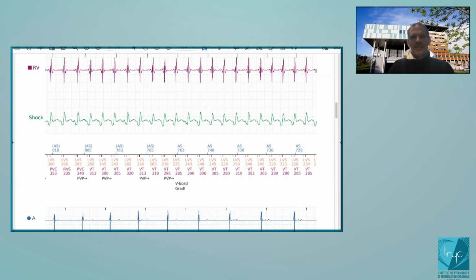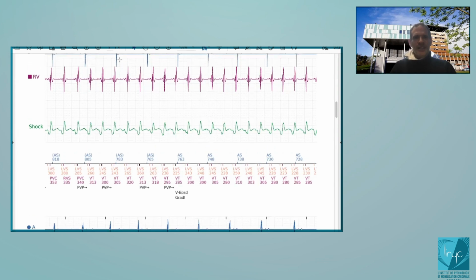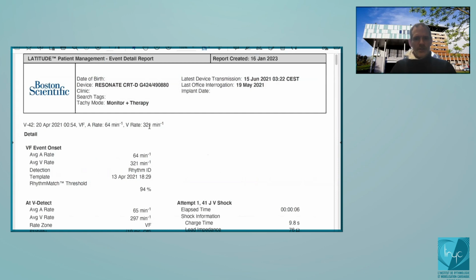So it's always the same name. It's very straightforward. It's always the same. Once you have understood the way it works, it's very simple. So 1, 2, 3, and then you have here 8 out of 10. But first you need 3 consecutive cycles. Okay, good.